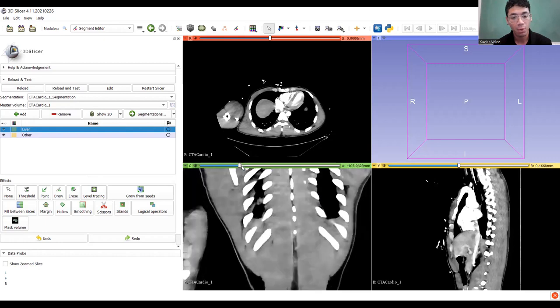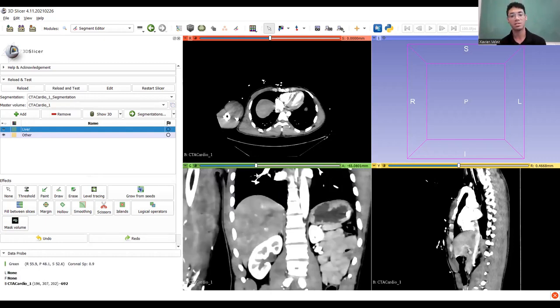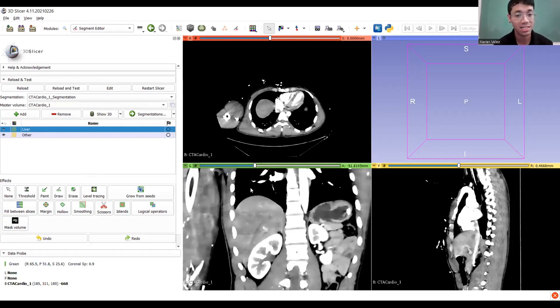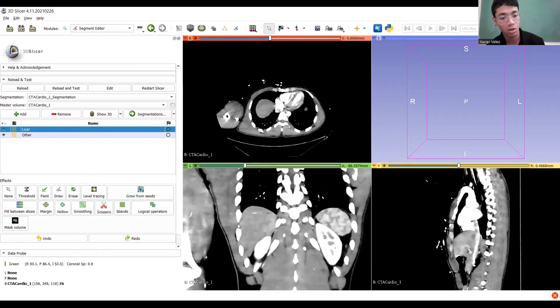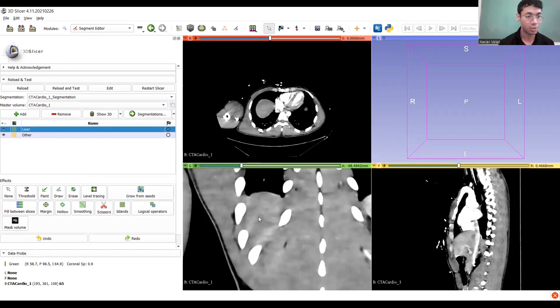From here, we're pretty much just going to go through and briefly tell Slicer what we want to be liver and what we don't want to be liver. And the fun thing about Slicer is that it's really smart. You don't have to do a whole lot of manual work. So when it comes to actually doing our side of this, it becomes pretty easy.